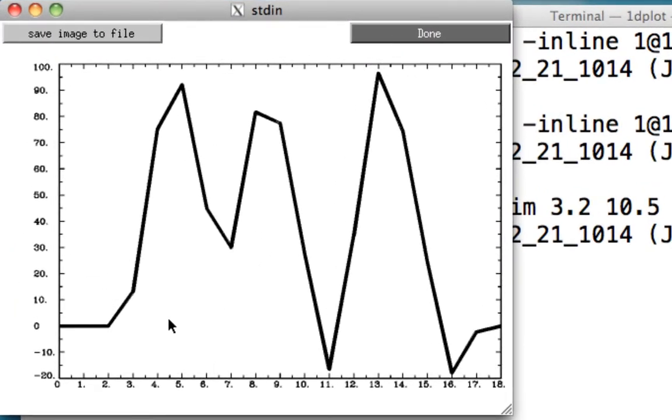So you can see here, at about 5 seconds, bumps up, goes back down a little bit, comes back up. I guess they're in TR, sorry. And then later on, about 11 TRs, there's another bump. So that should give you a pretty good insight into how these ideal responses are created, and also there's some overlap in how they convolve with each other.